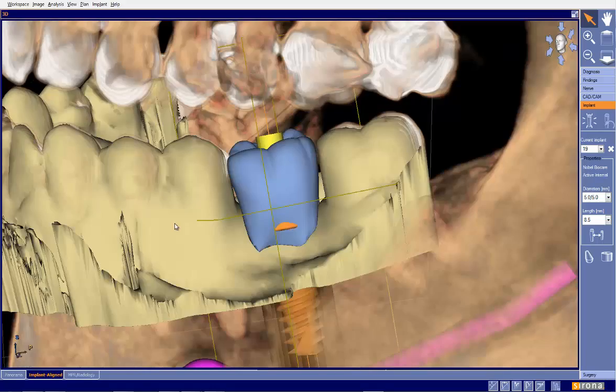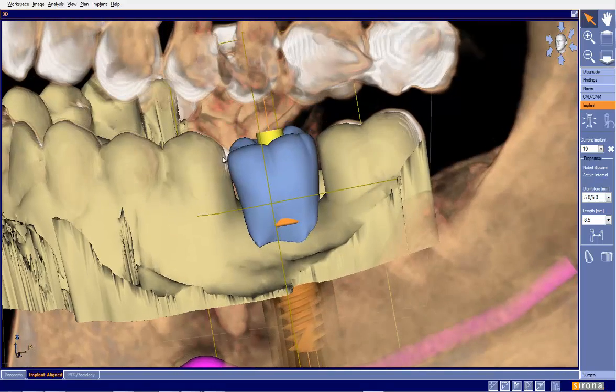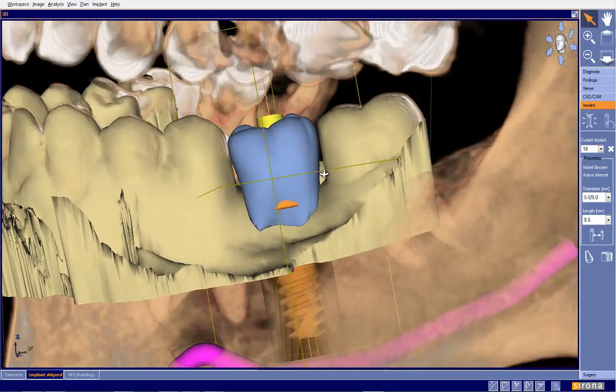The other thing that allows me to do is check the design. So let's talk a little bit about this. This is a pet peeve of mine, and one of the things that we talk about in all our classes: when we design these teeth, we need to design them based on what we're seeing.